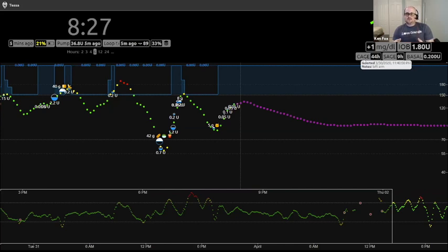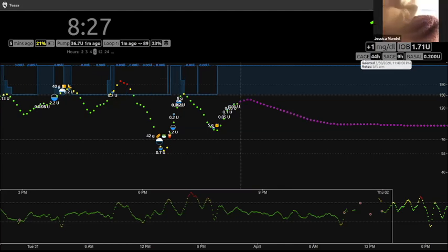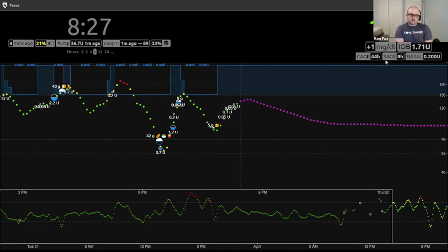So if you've never used them, if you've never used the activities to turn them on, they'll be NA. Or if the last time you used it was a long time ago, it'll just kind of stop calculating. So when you do a site change, currently Loop doesn't log it into Nightscout for you. So we'll get to how to log these. But this is all manual.